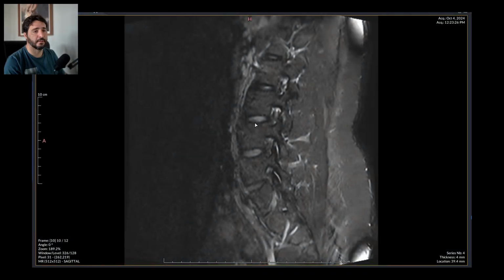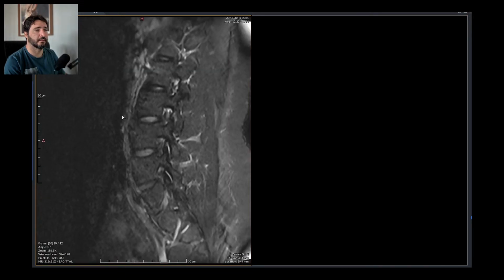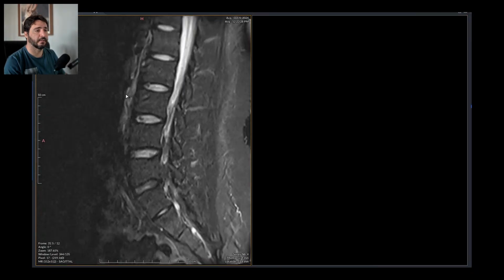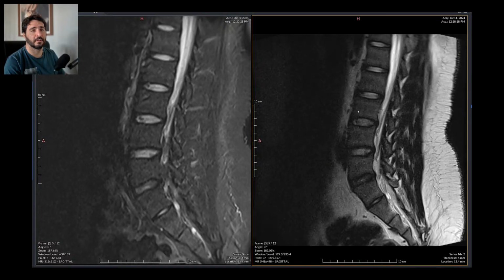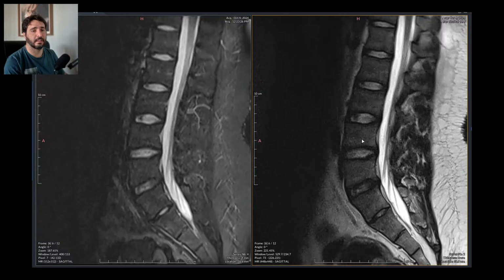So let's grab another spine MRI. It's a lumbar spine, and if it keeps going like this, I'm just going to jump over to the emergency queue and grab some CT scan there to see if we can report anything of use in this live stream, because things aren't looking good right now. Oh, of course. Let's make it as noisy as we can.